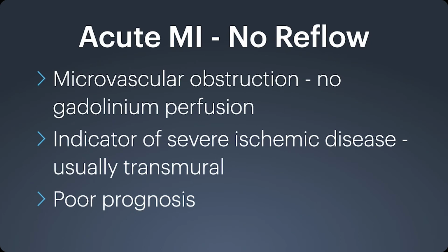The other phenomenon is what's called no reflow. No reflow is an area of microvascular obstruction. So you get obstruction of the end arteries and capillaries within the area of infarction, and it's a sign of acute myocardial infarct. In fact, during the development of the infarct where microvascular obstruction forms, gadolinium does not even reach that portion. And so there's no enhancement of that myocardium, either on first pass perfusion or on delayed enhanced imaging.